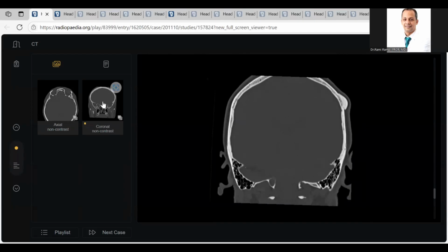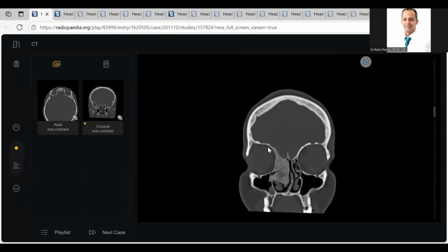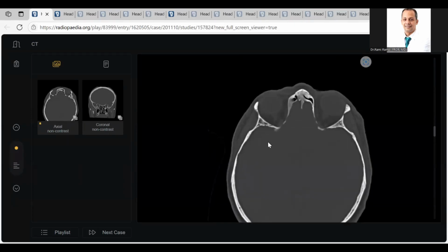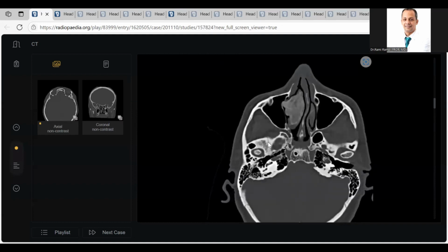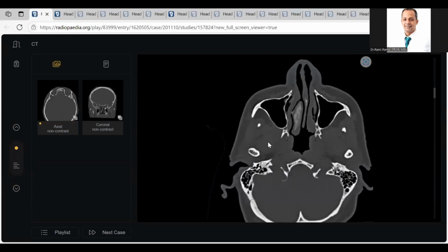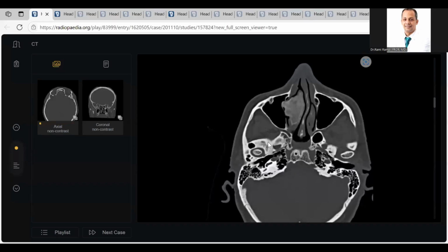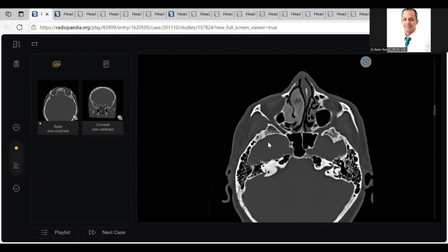This case is very classic but atypical. Why? Most of us face the fibrous dysplasia in long bones, multiostotic. See here, this is a little bit tricky. Especially, I start with axial. This is an expansion with ground glass appearance. In your mind, translate it into fibrous dysplasia. And later on, if you want to describe, there is some obstruction of the right osteomeatal complex and the nasal cavity. This is very good. But at least first, you should give me the proper answer: fibrous dysplasia. Next candidate, please prepare yourself.